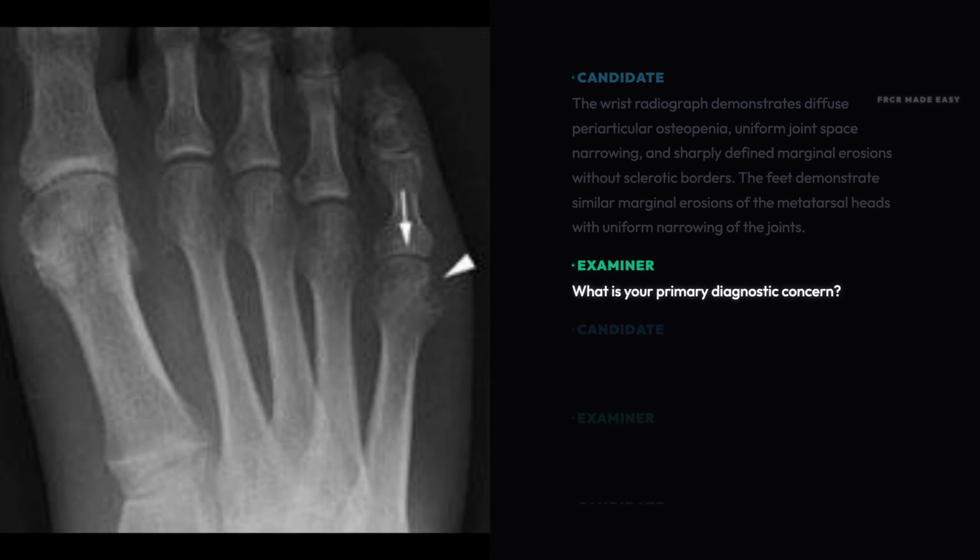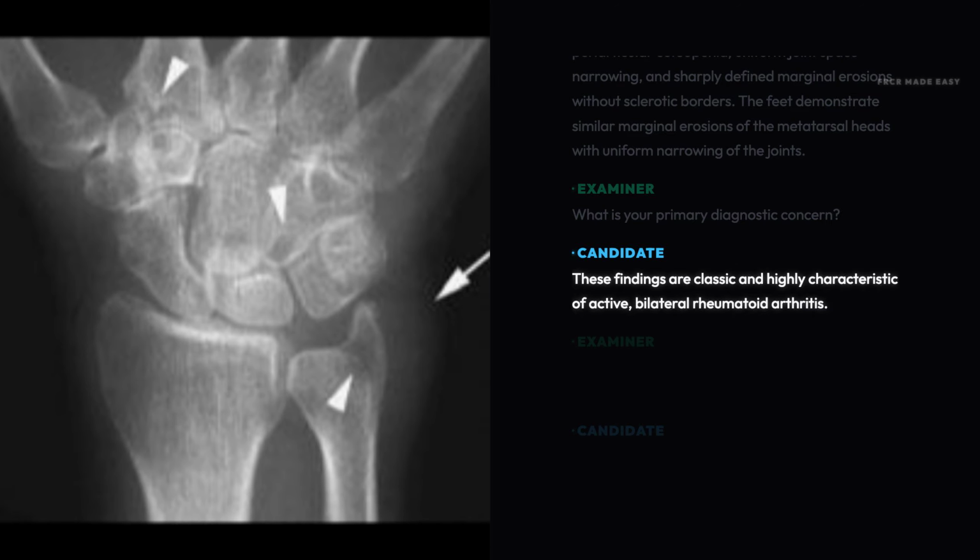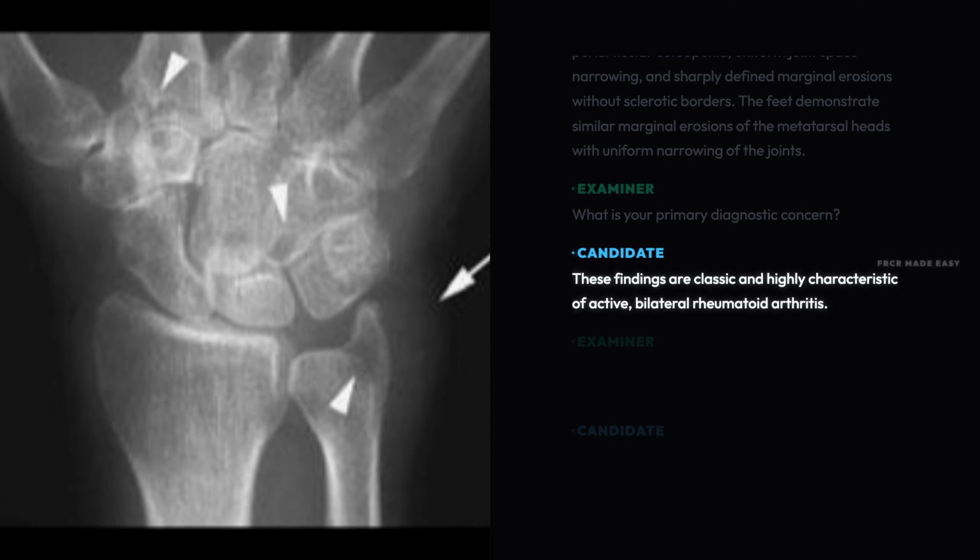What is your primary diagnostic concern? These findings are classic and highly characteristic of active bilateral rheumatoid arthritis.